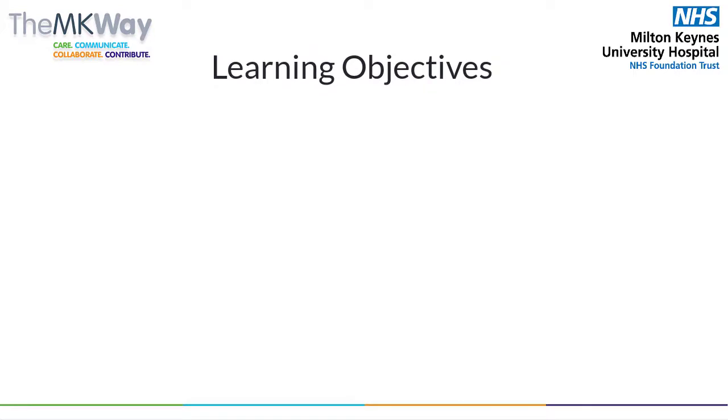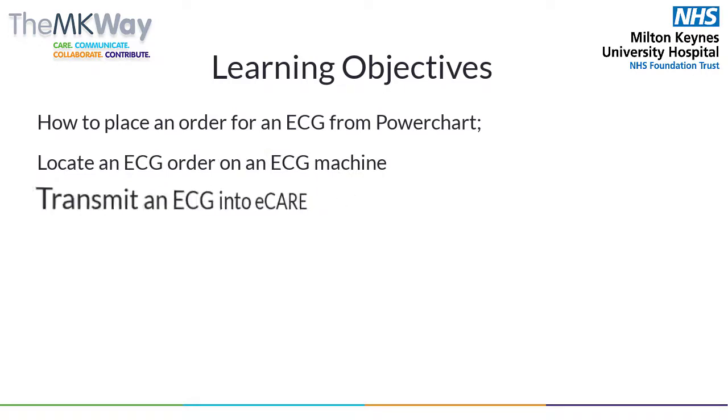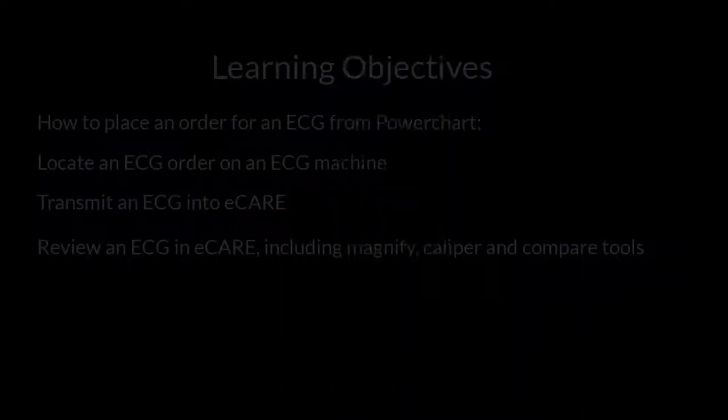In this video, you'll learn how to place an order for an ECG from Powerchart, how to locate an ECG order on an ECG machine and transmit the ECG into eCARE. You'll learn how to review an ECG in eCARE, including the use of the magnify, caliper and compare tools.